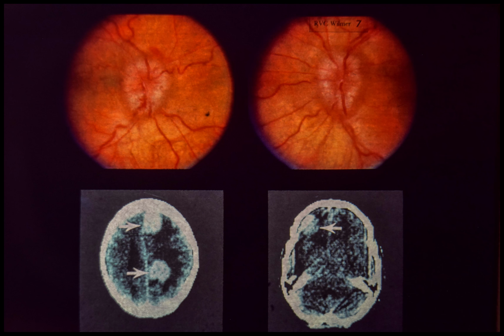Lower left. Computerized tomography, or EMI scan, shows two dense lesions in the right frontal and right occipital lobes. The surrounding lucent zones probably represent cerebral edema. Lower right. A second EMI scan, taken at a different level, shows a left frontal lobe lesion. Other cuts showed a total of 7 distinct intracerebral masses. Biopsy established a diagnosis of metastatic intracranial malignant melanoma.